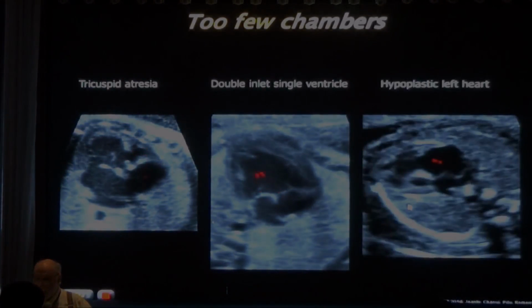And here we have a left ventricle that does not look normal. First, it's not long enough. Second, it's more round than normal. Third, it has this big white line around it, which is called endocardial fibroelastosis. I don't have the video clip, but I can tell you that the blood was going from the left atrium to the right atrium, into the right ventricle, to the pulmonary artery. This is also a hypoplastic left ventricle. And this is now one in which the left ventricle started developing but could not continue. So one has no left ventricle, and this one has a small left ventricle.